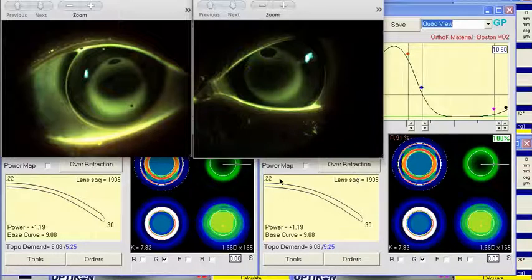The slit lamp photos you sent were pretty helpful. They showed nicely here and on both eyes. And it looks like the lens is dropping low. So you see superior edge there, superior edge there. Lens is low and you're getting a nice oval treatment zone, and that can definitely induce some toricity. So to address that, I would try to get this lens to shift up a little bit. With younger Asian patients, sometimes that's tough due just to anatomy.